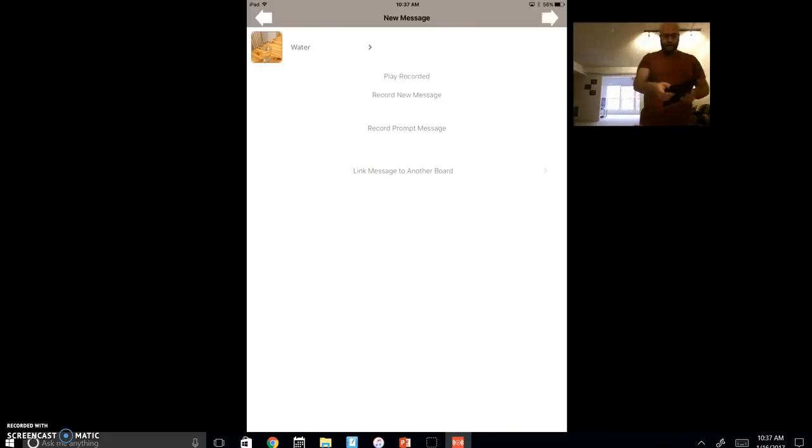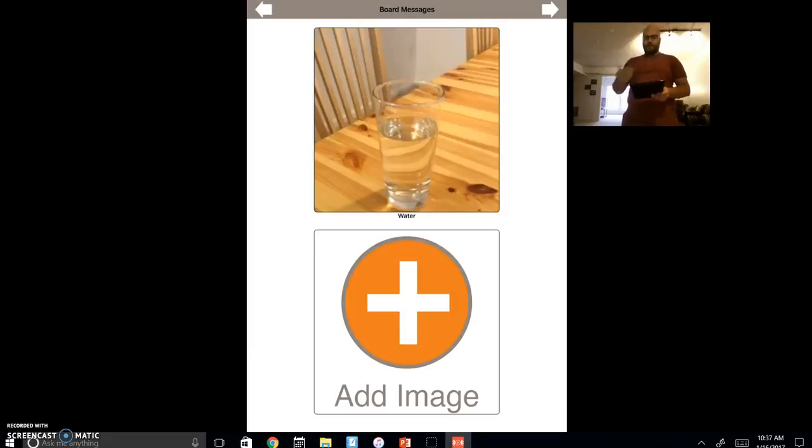So whenever you hit play now, I am thirsty. Could I get a drink of water? Alright. So now you've got your message. Hit the arrow for the next one, and then it automatically prompts with another picture, so I'm going to get the plus.